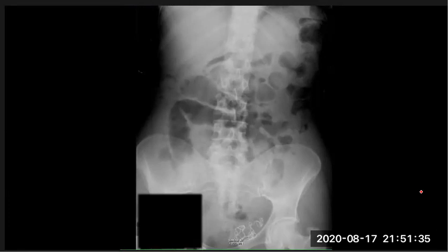Make it more specific. Pelvic gossypiboma. Very good. This is gauze left post-operatively, and this is the gauze in the left side of the pelvis. The patient has some abdominal pain with some gaseous distension. Very good.